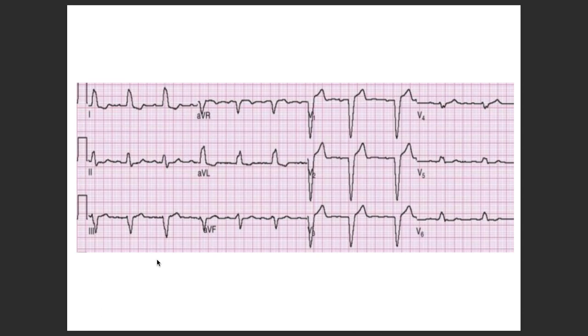Again, break the words. Ventricular tachycardia. So when you look at the ECG, it will be ventricular in origin. How do you say atrial or ventricular origin? In the last session, I had explained that if there is supraventricular origin, most of the time they are narrow QRS. But when they originate from the ventricle, most commonly it is a broad QRS, right? And there will be a tachycardia, right? So in tachycardia the heart rate is going to be more than 100.